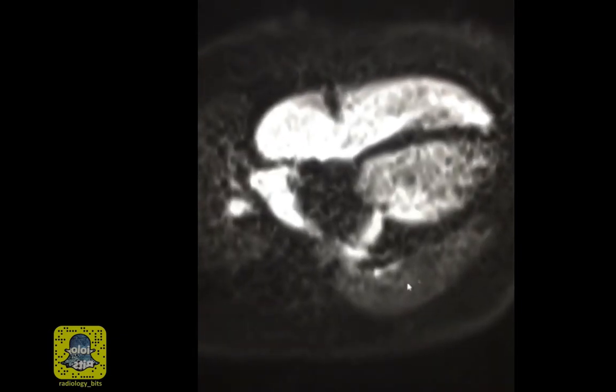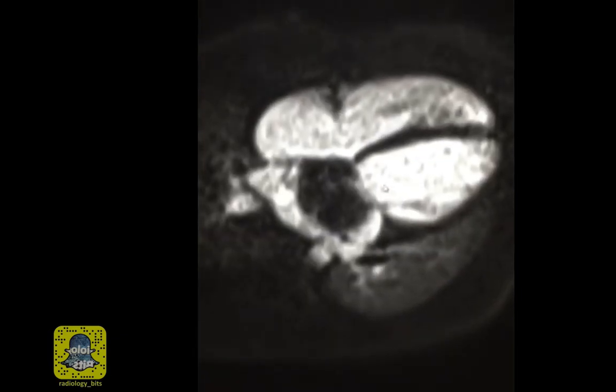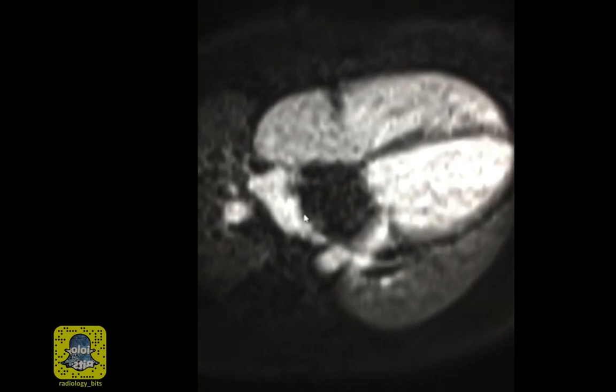Here's an image from an MRI on this patient. This MRI sequence is with contrast. It's real time, and it's called first pass perfusion, where you could follow the contrast bolus. It's a very neat sequence, since you could see the contrast filling the right-sided cardiac chambers, then going to the lung, and then back into the left side. And of course, the filling defect in the left atrium is seen nicely here. Not only that, you could see the prolapse of the lesion into the left ventricle.